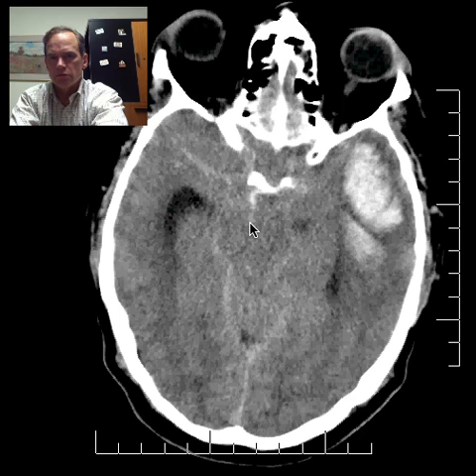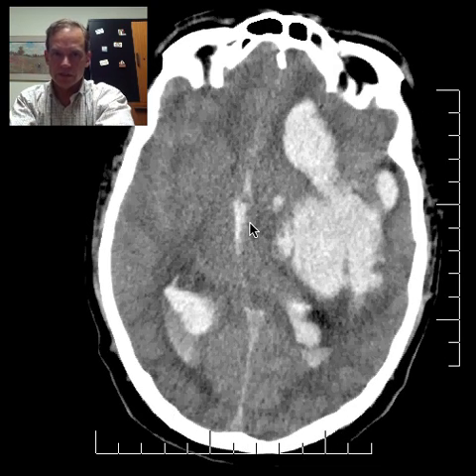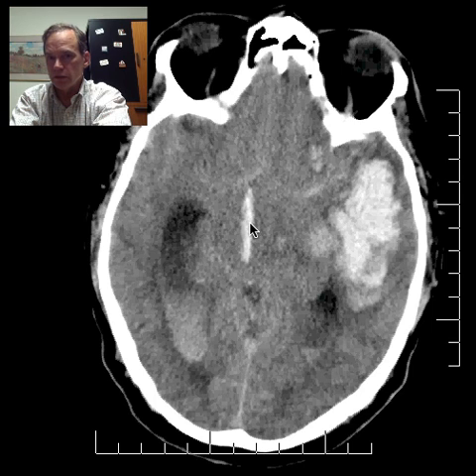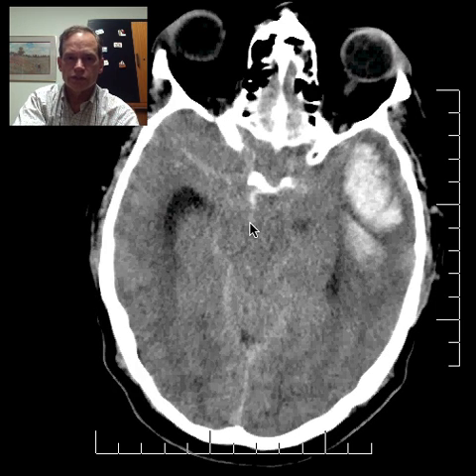This is a disastrous event, of course, but it does display some important things of anatomy and pathology that we see with this kind of process, whether it's an acute hemorrhage or sometimes a tumor that has been growing over time. And you may remember that we have seen cases where we would see this tentorial incisura. Remember that?